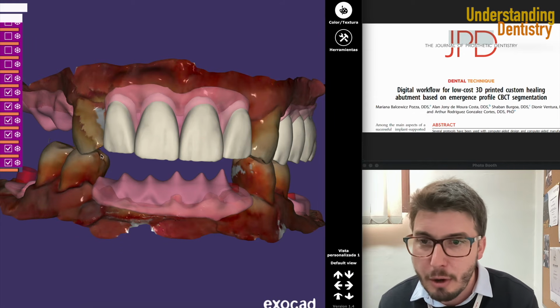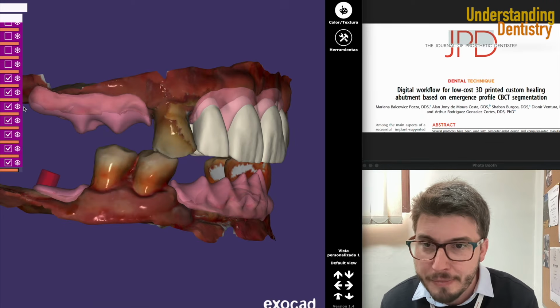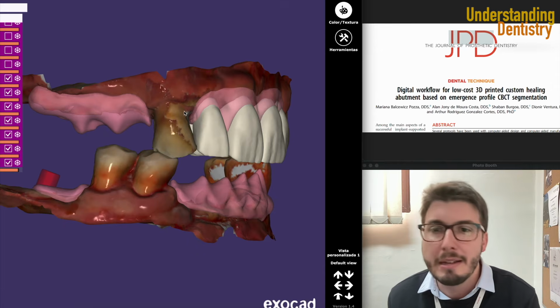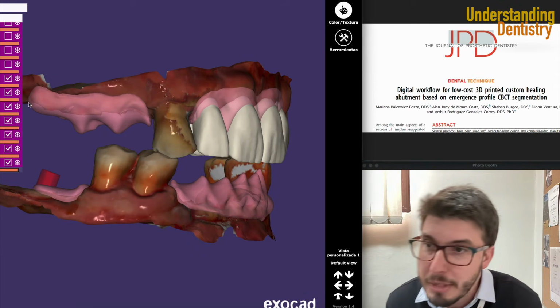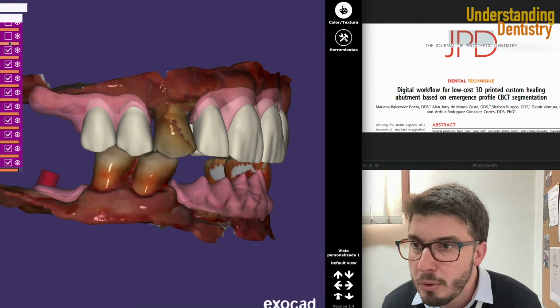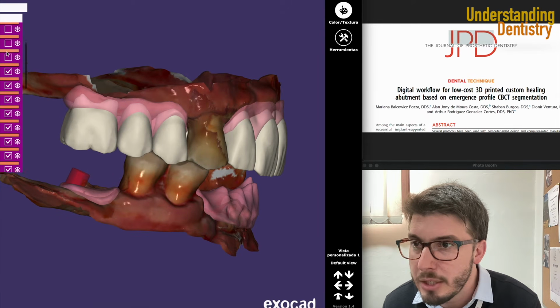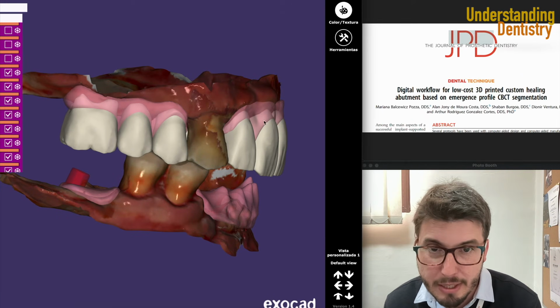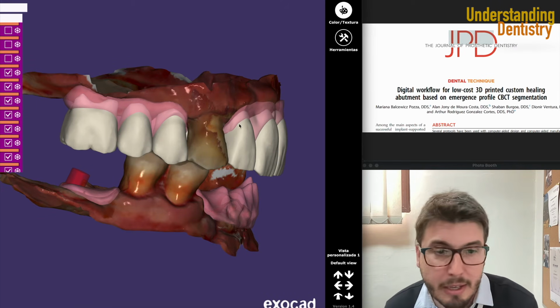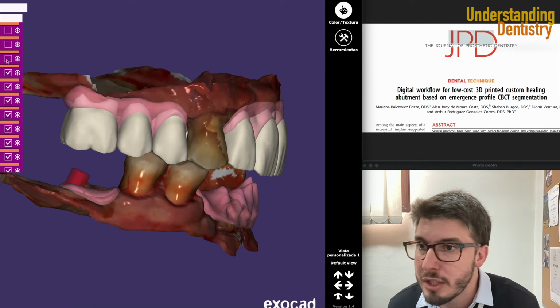Okay, then you have the other lateral, and then the canine is planned to be kept. So maybe you would remove a restoration or do a crown, or here it's part of the planning to keep the canine as it is. So now you have the premolars, and then the upper molar, and then we need to understand that we need space here. That's why we are taking advantage of this space to have the gingival tissue as well. And that's why we have FP3 type of prosthesis in the Misch classification.